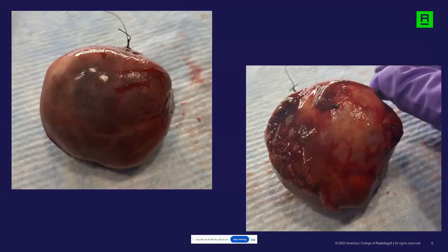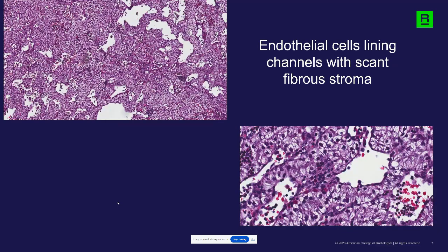So this lesion was resected, and you can see it's a red, fairly pale vascular mass that was resected. It came out very encapsulated. And here it is on histology, where we see these endothelial cells lining these different vascular channels of different sizes. And this patient also was GLUT1 negative, which kind of gives away the diagnosis, since I'm telling you about the GLUT1 negativity in this mass.